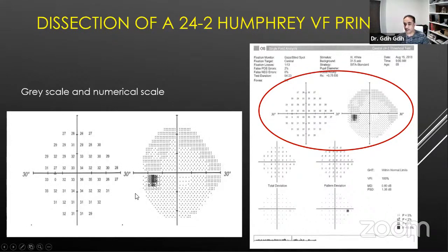Now, you may hear about something called split fixation, in people with advanced glaucoma. When you hear the terminology split fixation, you go to the 4 areas that are tested early in the visual field to determine the patient's fixation points.